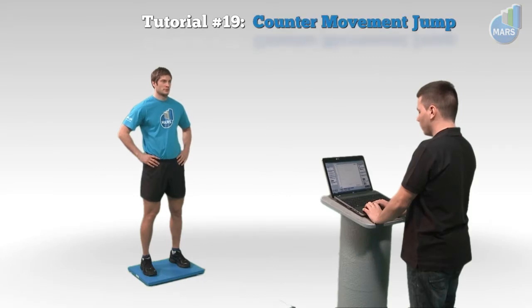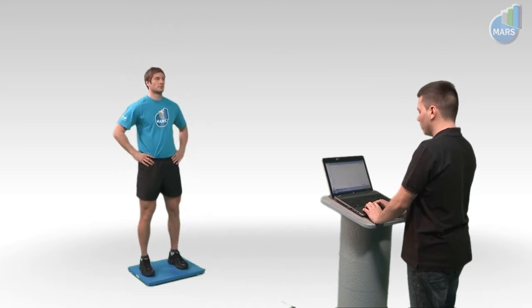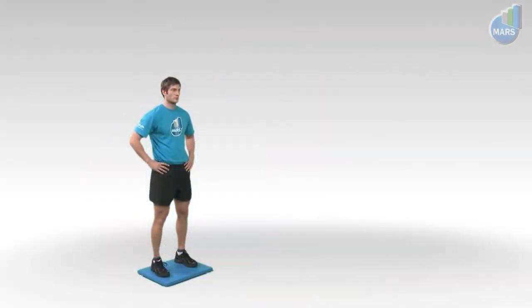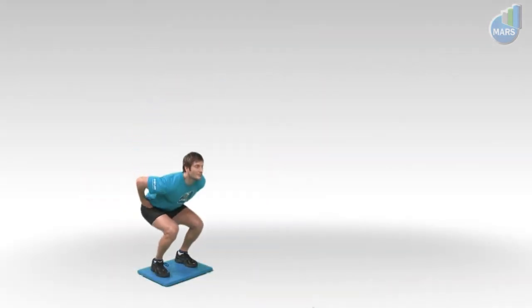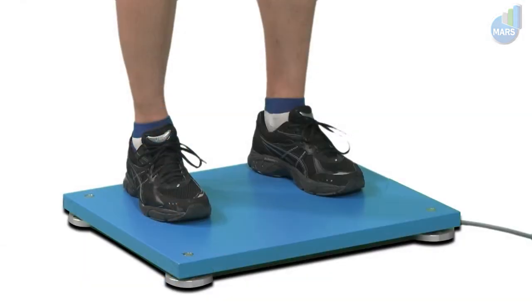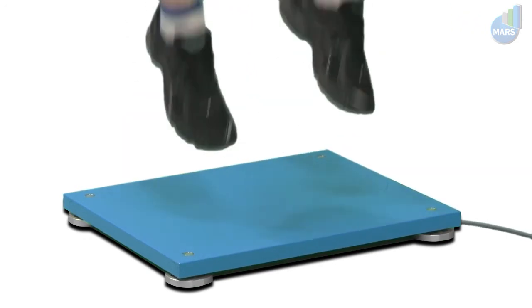A counter-movement jump is a vertical jump and among the most often used tests for the maximal anaerobic power output of the lower extremities. It is an eccentric-concentric muscle action that involves the coordinated extension of the torso, hip, knees, and ankles. Based on the ground reaction force-derived parameters, the dynamics of this elementary movement pattern can be thoroughly studied.